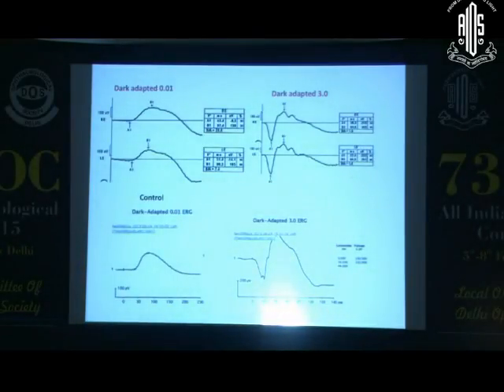So we did an ERG, and so that's the rod scotopic response. That's near normal. And look at the combined response. So there is a mild reduction there, and look at that. So you have the B wave. So a normal B wave should look like that.